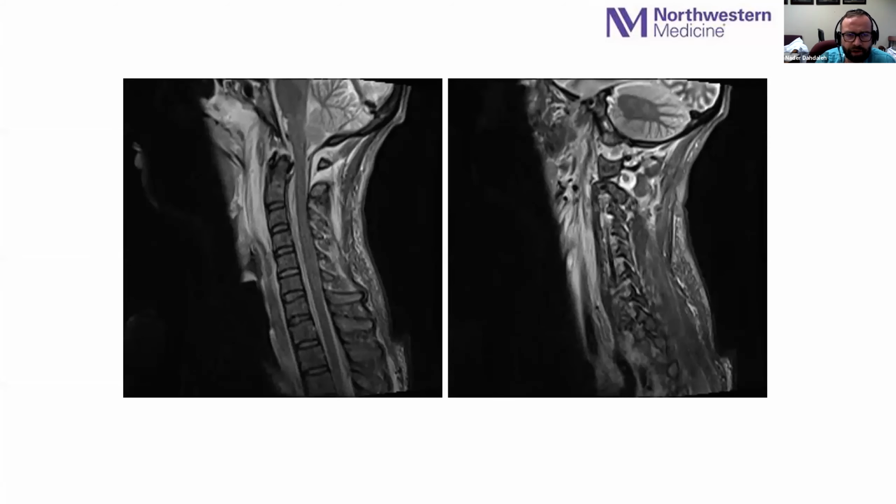And this is an MR. What do we see here? We surely see total disruption of all the ligaments from front to back that hold up the neck to the upper cervical spine. You can see here with that STIR image, mid-sagittal one, the apical ligament, the anterior atlanto-occipital membrane, all the posterior tension band is gone. And you don't see any fractures with these injuries. It's a purely ligamentous injury, a distractive ligamentous injury, but definitely creating extreme instability to the cervical spine.